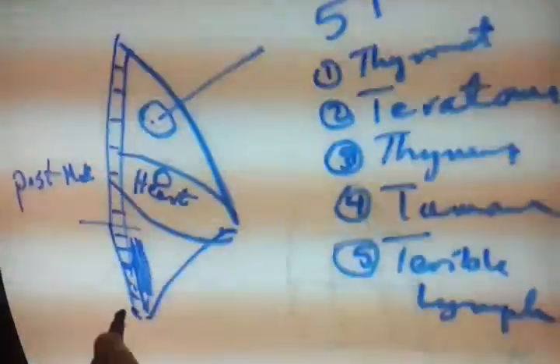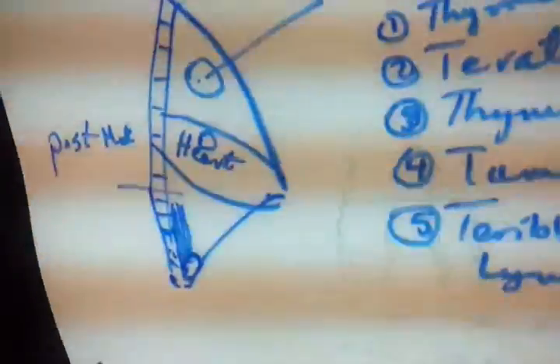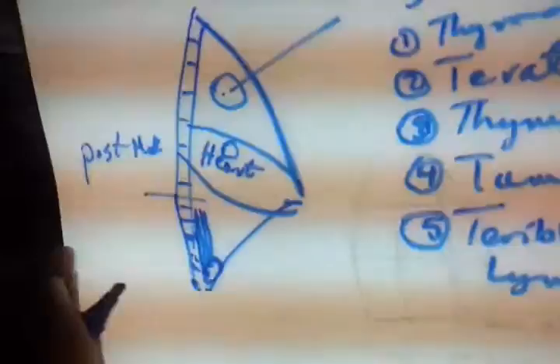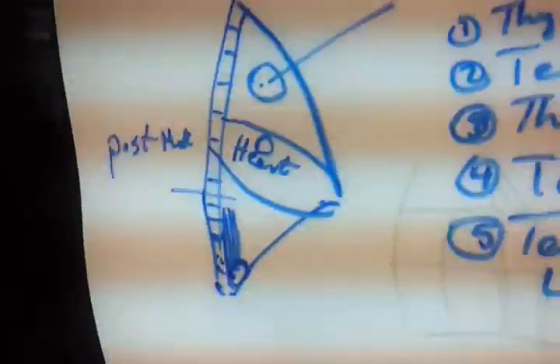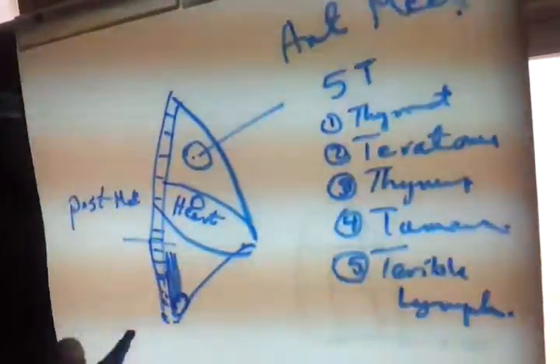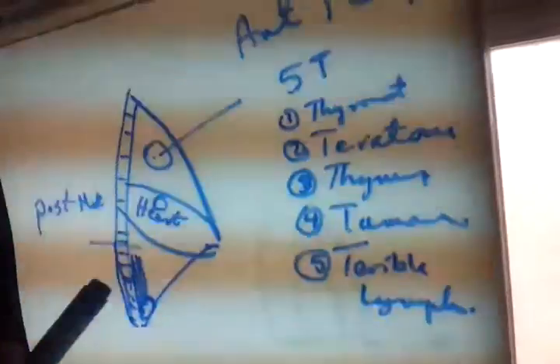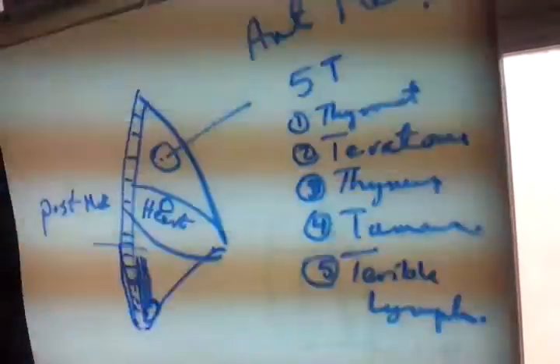Any diaphragmatic hernia might show a mass there in the esophagus. Any dissecting aneurysm in the aorta might show in the posterior mediastinum. Any vertebral disease, tumor, masses, paravertebral abscess, any neurological masses or tumor, neurofibromatosis and neurofibroma in this posterior mediastinum.